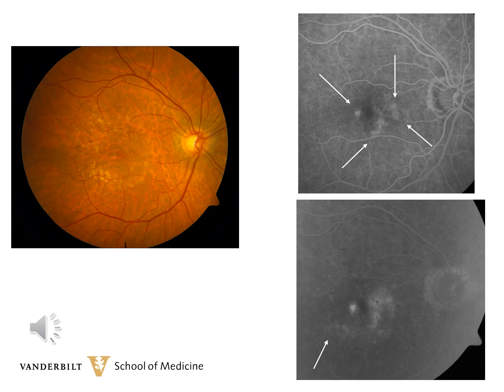On the inferior angiogram, the late angiogram, the arrow points to an area of hyperfluorescence that did not light up early on. The question is, does the choroidal neovascular membrane extend to this lower arrow or does it not? That is a difficult call, and therefore you can see why this patient could not be treated with laser as in the macular photocoagulation study protocol. So this is why so many people with age-related degeneration could not be treated with laser, why we kept looking for another treatment.